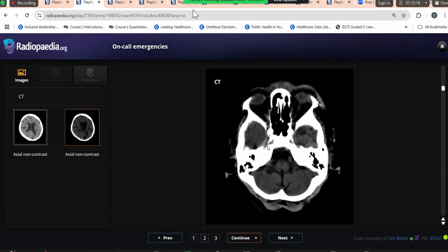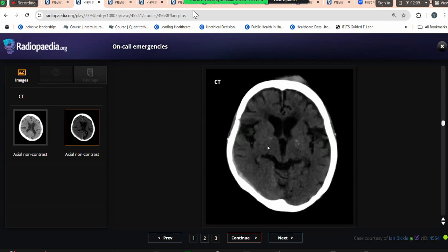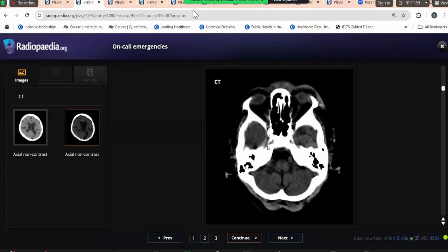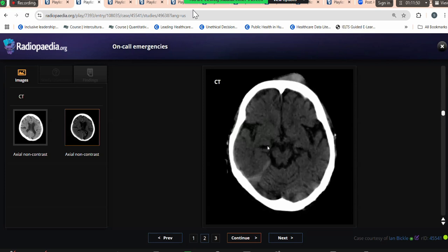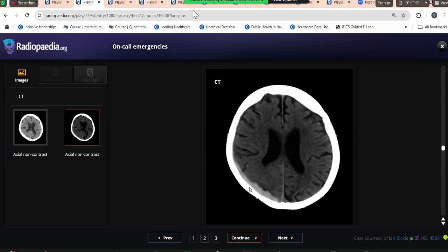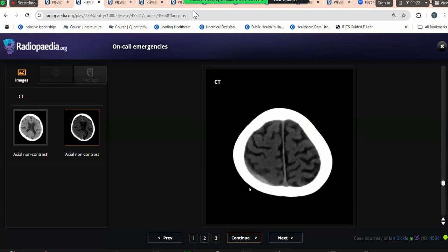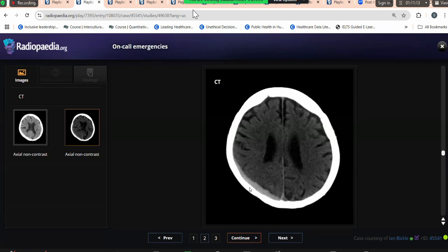Normally, for such patients, I would look for signs of dural thrombosis. There is slight hyperdensity along the tentorium cerebelli. Considering the findings of a neurological deficit and the right-sided hyperdense tentorium cerebelli, a concave-shaped hyperdensity is noted along the right posterior parietal lobe. So this is a case of subdural hematoma along the right posterior parietal lobe with right-sided subarachnoid hemorrhage. I would pick up the phone, inform the referring physician of the findings, and refer this case to the neurophysician for further evaluation.